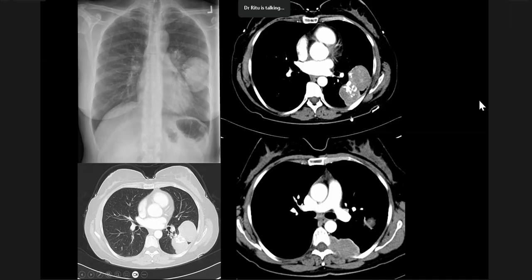One is a bilobed mass sitting in the pleura here, which has areas of calcification. And then the second mass, which is more medial and posterior, you can see that it actually widens the intervertebral foramina there, and is trying to extend into the nerve there. And that's where the patient was actually having chronic back pain.